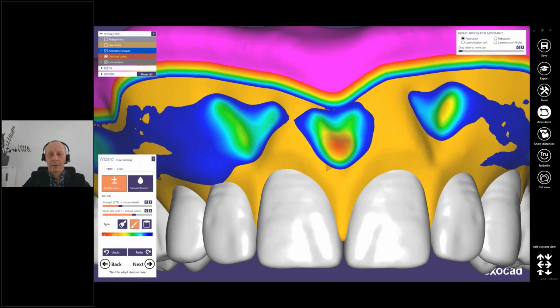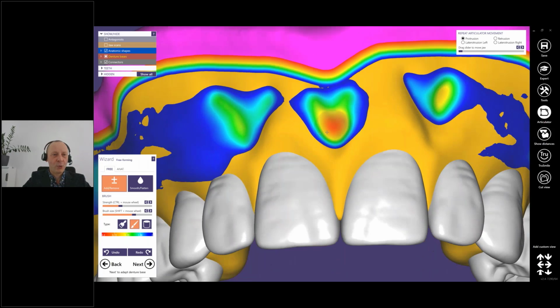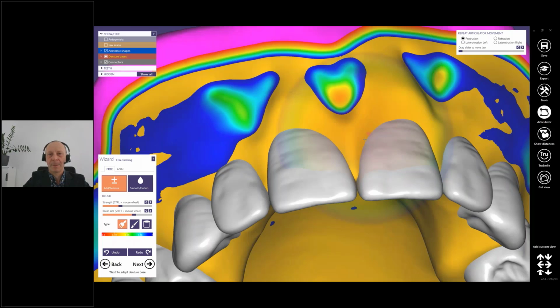This is a little bit too much, probably too thin, maybe a little bit dangerous.